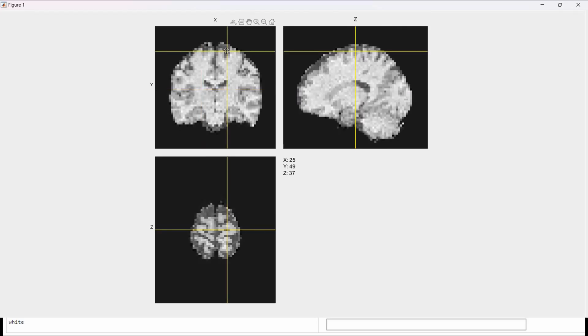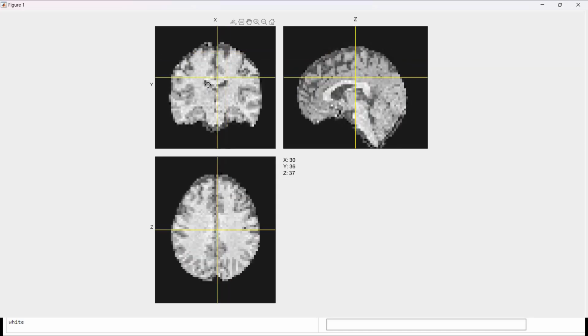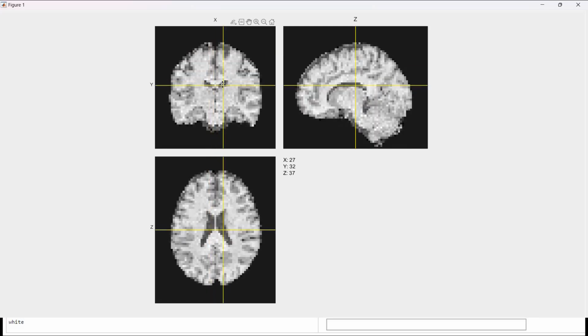These images are aligned into what is called MNI space, which is a standard space for brains. All the individual subject images are transformed such that they are squished or stretched a little bit so that I can match all the ventricles of all the subjects together, and the shape as well. Some brains might be small, some might be big.